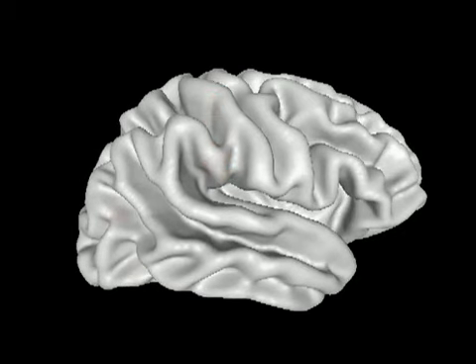This is the Brain Surfer program, and it will be released soon along with other new features, but this is a heads up on a new procedure, particularly the projection of the sources onto the neocortical surface.